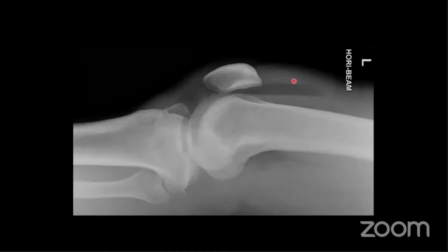Right, what's this? There are several findings, so just shout out. Okay, we've got a few answers coming in.